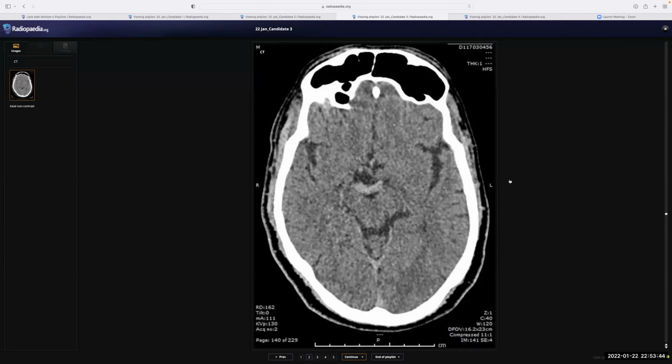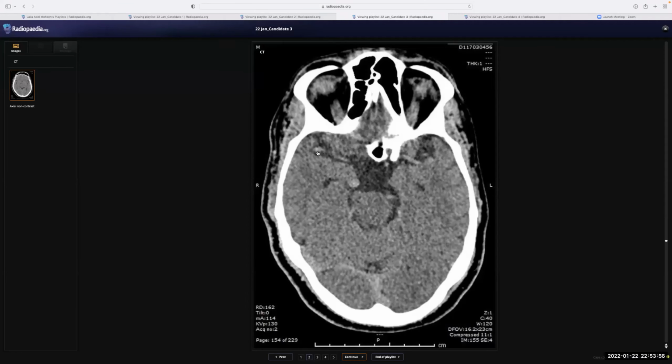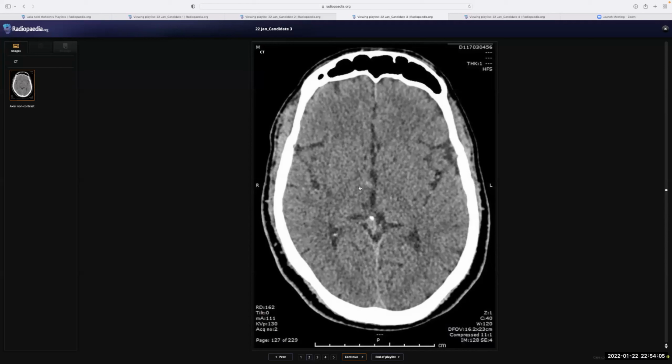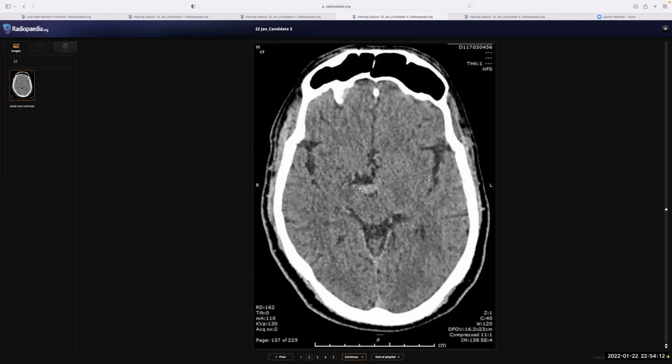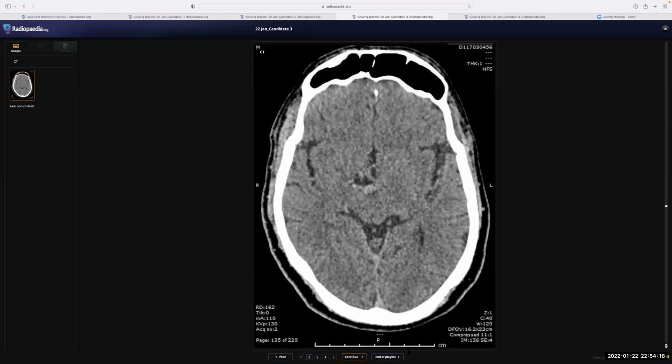Okay, fine. So, Dr. Noor, this was the last case. I disagree regarding the density because all the vessels are dense, even this one as well. If you go a little bit, you'll find that the middle cerebral artery has the same density as the basilar. But you are right about saying if you are doubtful, try to make sure. It's good that you mentioned that you want to see the stroke window. Also, because there is no edema and no mass effect, it's better to make sure. We should have taken this patient to MRI to make sure what's going on here.